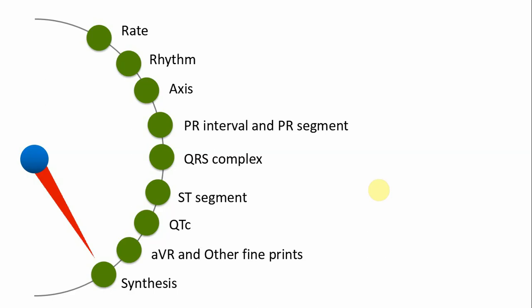So don't read the ECG alone. Look at the patient. How old is the patient? What are the risk factors? Is it a life-threatening condition? Do we need to give some medicine like amiodarone, or is amiodarone actually going to kill the patient? If the patient has got hyperkalemia or tricyclic antidepressant overdose, and if we give amiodarone, that can cause harm to the patient rather than any benefit.